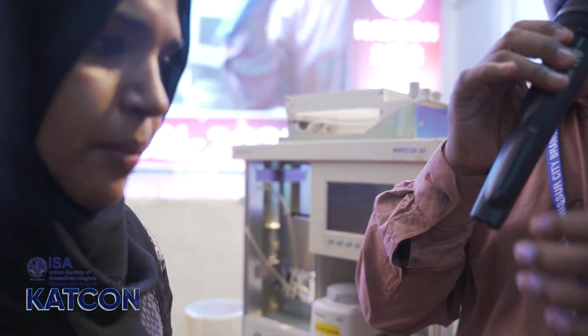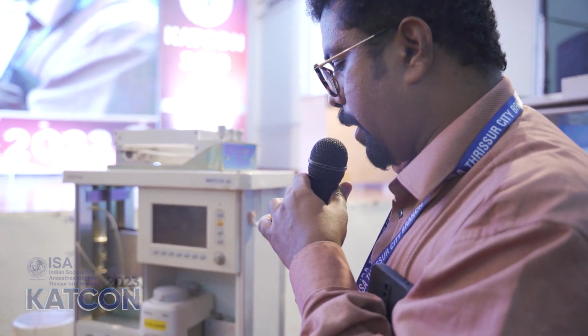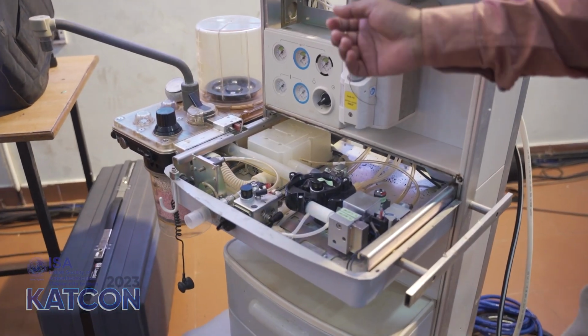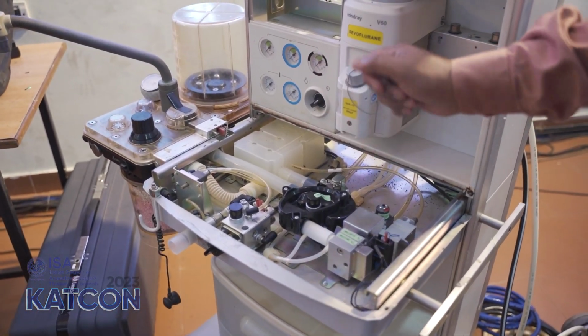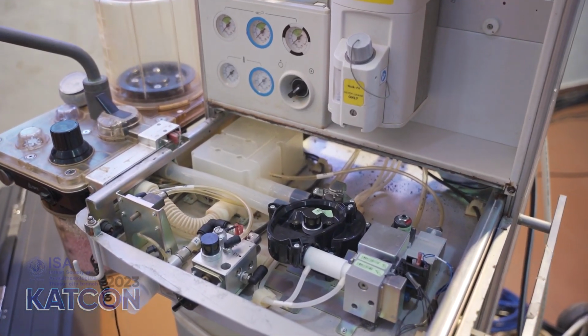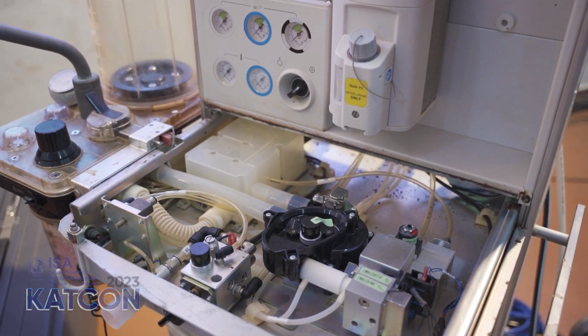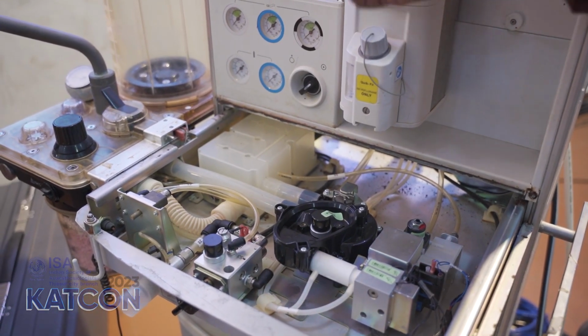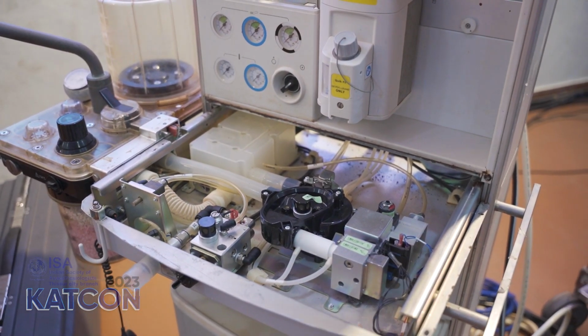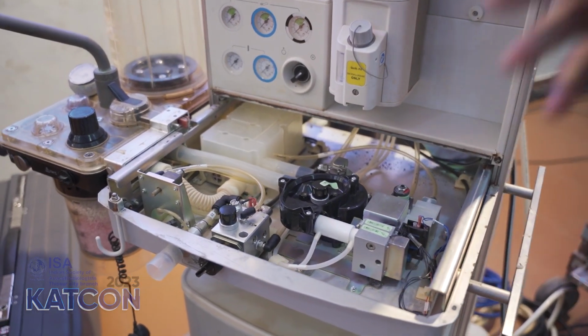Okay, thank you. There are so many tests, I will just mention one test, because you see the difference between the older and new machines. The new machines have flexible tubings. There is a possibility after service that the technician may have connected the nitrous and oxygen differently. So only by doing this single hose test, you can eliminate that. By connecting the oxygen pipeline, you close every other, disconnect the nitrous pipeline, and just see if the oxygen is flowing. That single hose test ensures that the inside connections are correct. So this should be done after service of the machine or at the start of every week.